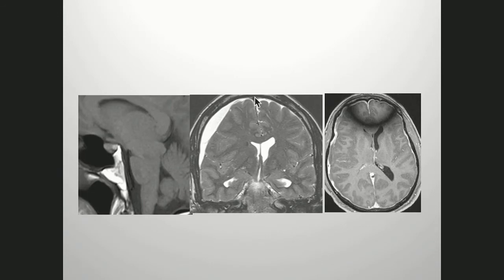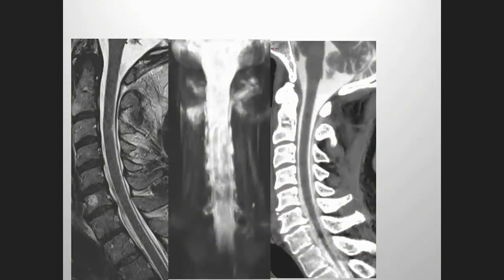Another cranial MRI, similar findings. I don't think it's easy to find anything else that causes this appearance. I know Dr. Levin mentioned that it could be a tumor, but when we see this kind of optic chiasm flattening, the distortion here, there's only one thing this is due to. This is due to intracranial hypotension CSF leak condition. This patient has a right-sided subdural and meningeal enhancement. Now I'm showing this case to see the spinal imaging, which is interesting.